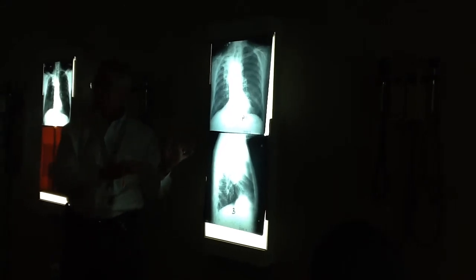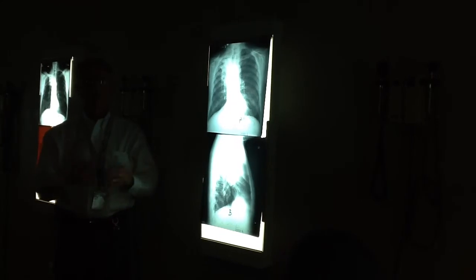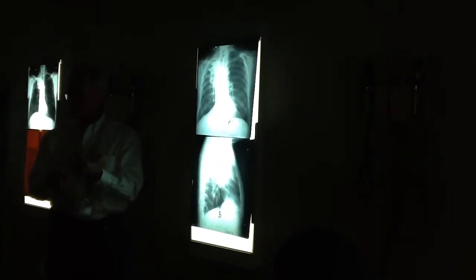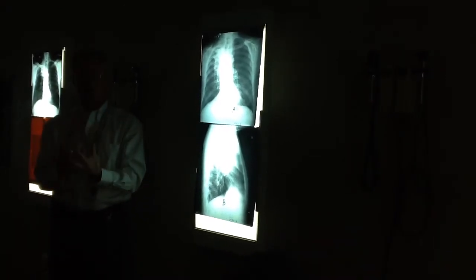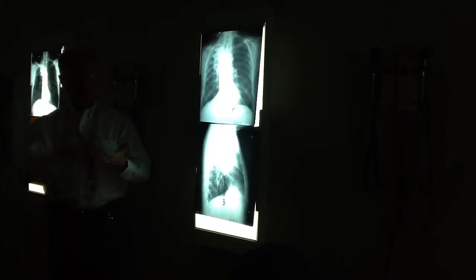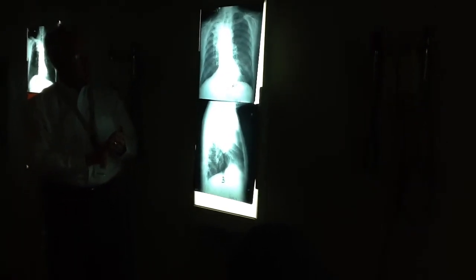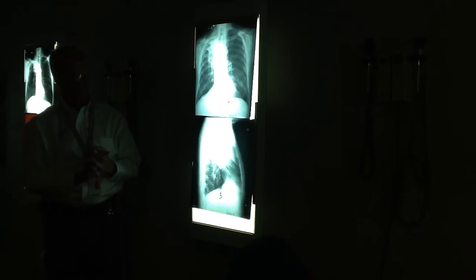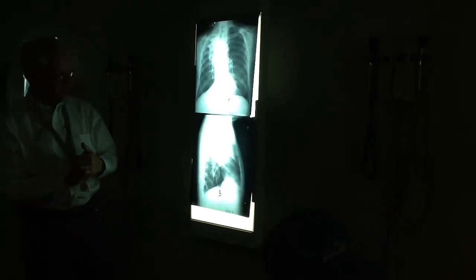It's not even common to see it on the right side, because everything has to happen just right in order for it to happen. You gotta have a central tumor, it's gotta be the right upper lobe bronchus, it's gotta sit there and enlarge the hilus, so that when it collapses, the fissure wraps around the tumor. So all of those things have to happen just right in order to have Golden's S sign. Classically squamous or small cell tumors will do this. And that's a nice example of Golden's S sign. Okay?